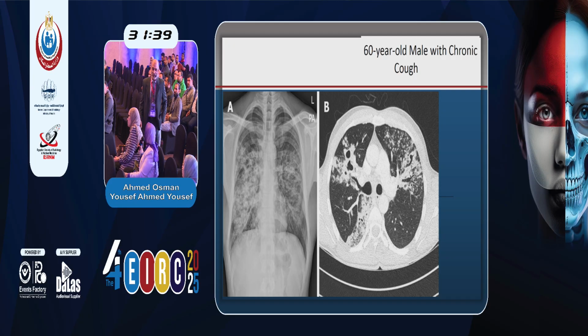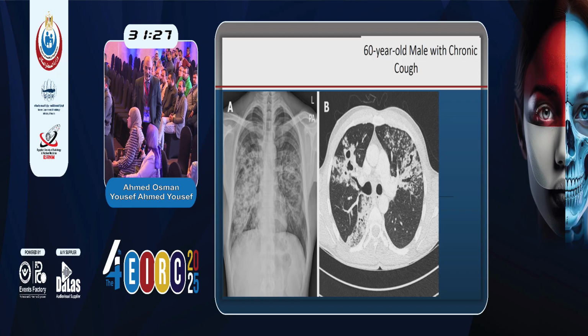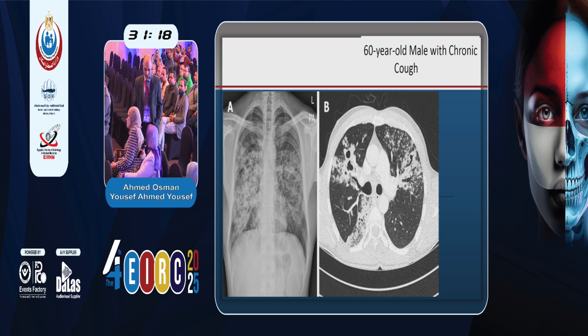What are the signs of old TB? Fibrosis in the upper lobes. Yes. Calcification. Yes. Calcified lymph nodes. Volume loss. Yes. It could be reactivation TB. I don't see the upper lobes, I mean I don't see the apical region here. Can the cavitation be reactivation TB? Can. Yes.